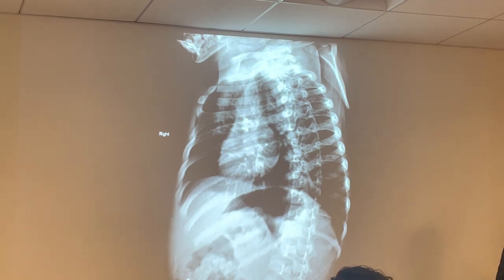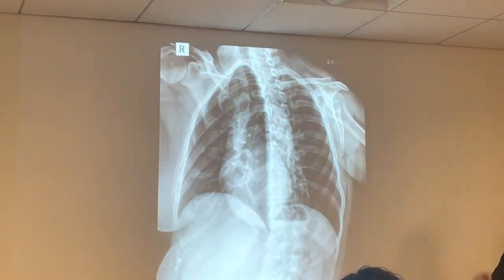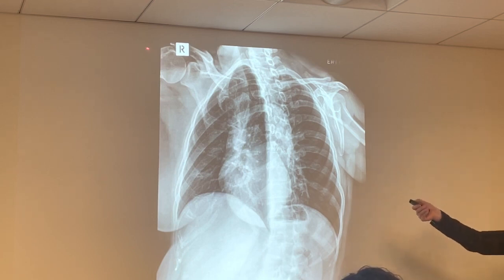which arm goes up? It's very easy. Whatever side's elongated is the arm you raise up. So based on that, which arm is up? The left. Which arm's up on this one? The right. Whatever side is elongated is the side you elevate. This is an RPO then? It's an RPO because we're marking the side down and the right side's elongated. It does make sense now. That's starting to click now, right?